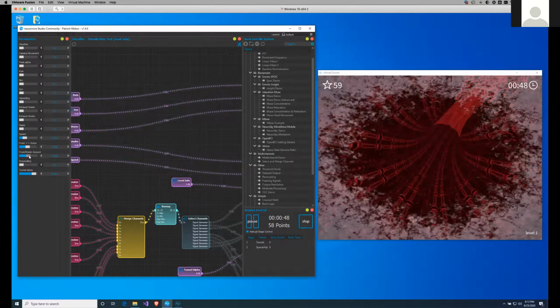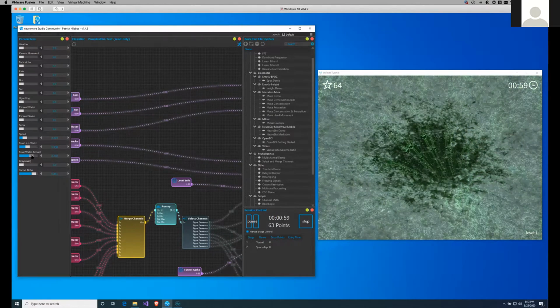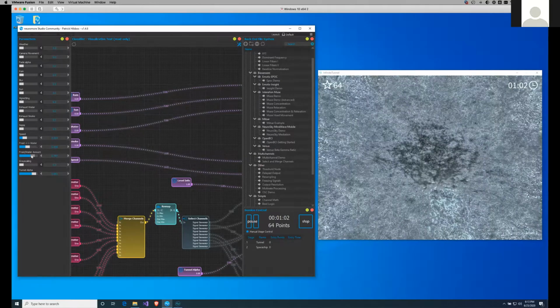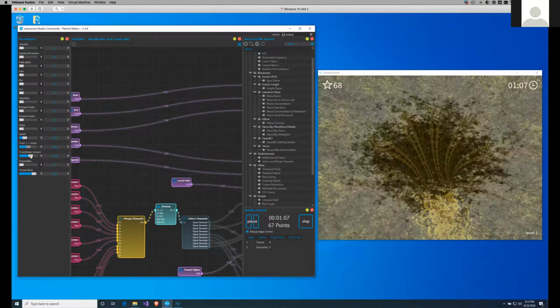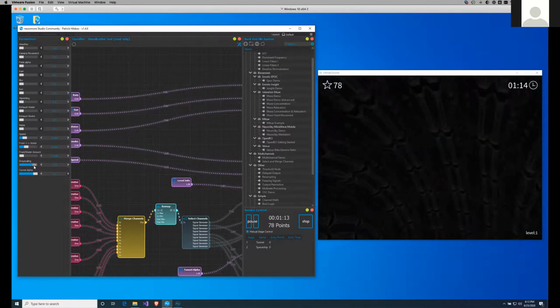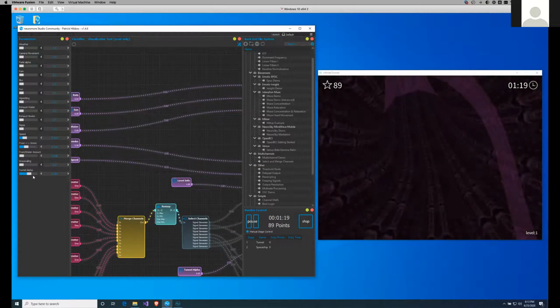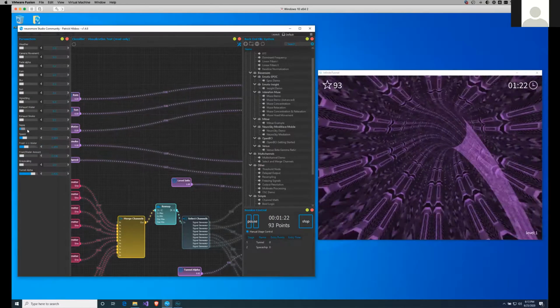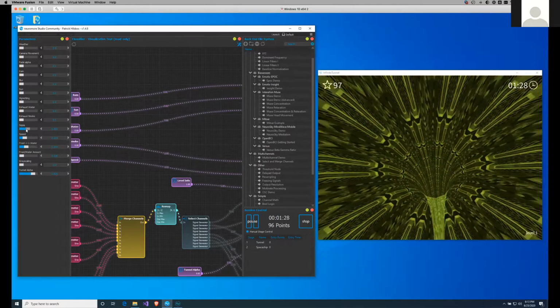And the other one is that we can add some frost to it and make it kind of icy. It looks pretty icy, and a training goal for a neurofeedback or biofeedback training session could then be, oh, just remove the ice or make it more icy, less watery. What we also have is we can grayscale it, so we can remove the colors from the tunnel. And what can also be done is a sepia, which is not like a grayscale, it's more like a vintage effect that we have here.